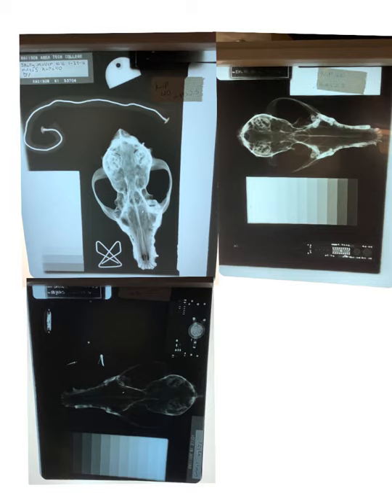So here are these x-rays again. This was our 40 kVp, our 60, and our 80. So the same x-rays we just looked at, but here they are all in one. So hopefully you guys can see, if we look at the step wedge, just how much different it looks at 40, where we can only see the first few, and then it's all white. Here we can see almost all of them before we start to lose it. And here it's really dark at the beginning, then we can see a lot of good ones, but we can actually see all the way through the thickest ones.